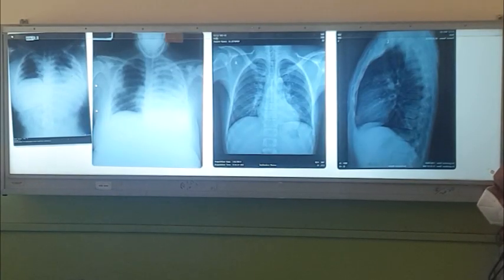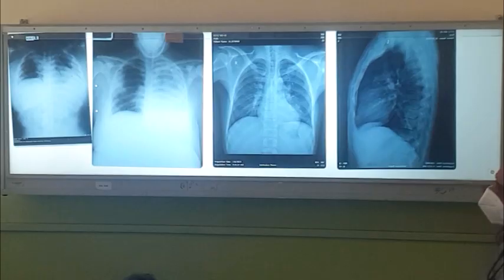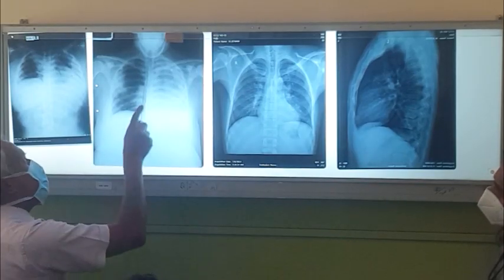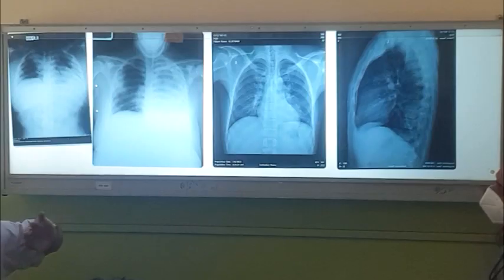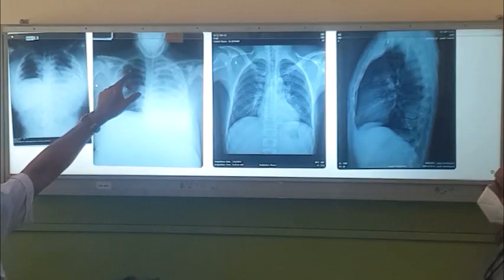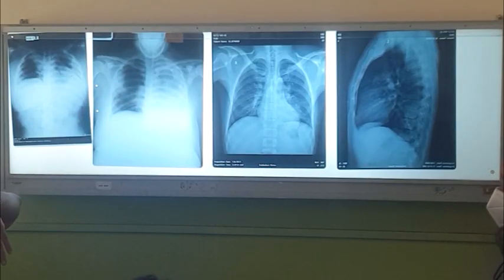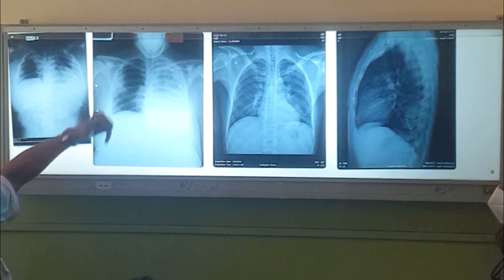And this must be an obese patient, right? Deep chest wall. Then you can see the whole spine. Although it looks whitish, you can see the whole spine, so this is an overexposed film, right? That is why this area, the normal lung tissue, is dark. So this is an overexposed, well-centered AP film.